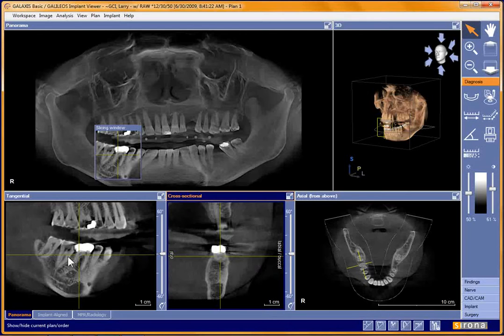If we want to hide our crosshairs to be able to see even better, that's what these little boxes along the bottom do. These allow you to hide the crosshairs here. If I had findings or implants and abutments and sleeves, which we'll talk about in another class, you can hide those, and they're hidden when you see it's a dark blue. This is our acquire or request the implant license. If I want to bring them back, just click again and we're back.